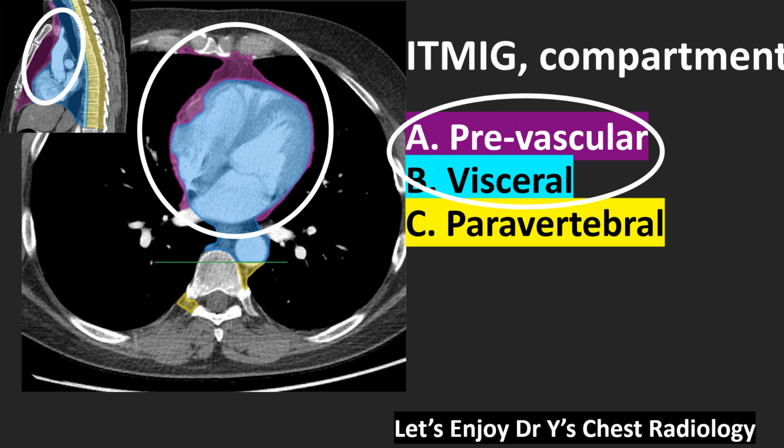ITMIG defined the compartment of mediastinum as prevascular, visceral, and paravertebral compartment. Among them, prevascular and visceral compartments are where they hide themselves in the axial CT. Thoracic malignant lymphoma.